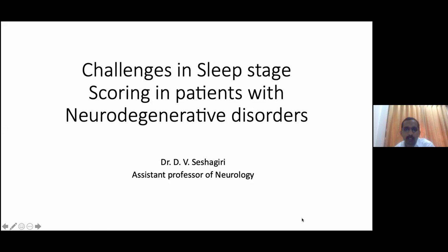Dr. Pulshan has explained very nicely how to score a basic polysomnography recording. I will be taking you through a few aspects of the difficulties you face in scoring under certain conditions, just a little above what Dr. Pulshan told. Like always, sometimes it may not be so easy to identify.